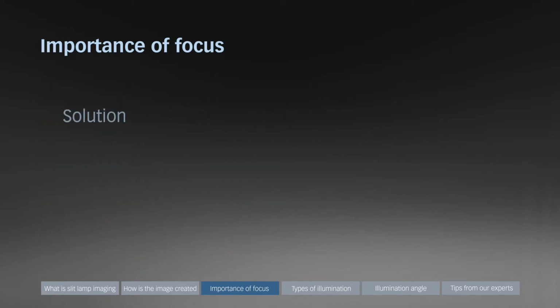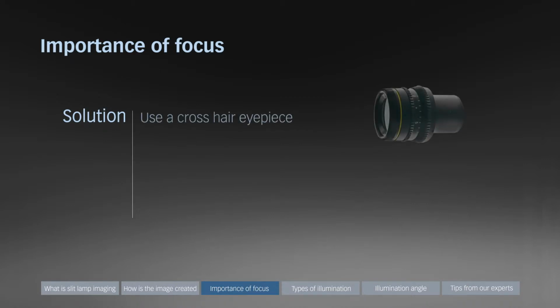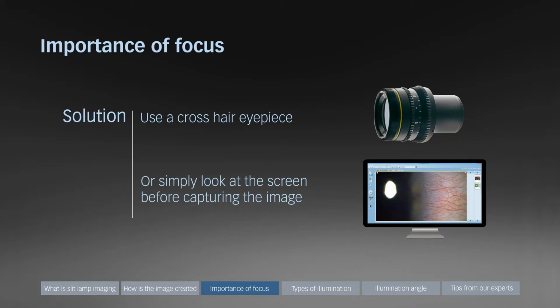To ensure that your images are always in focus, use the Haag-Streit imaging crosshair eyepiece, or simply look at the screen before capturing the image.